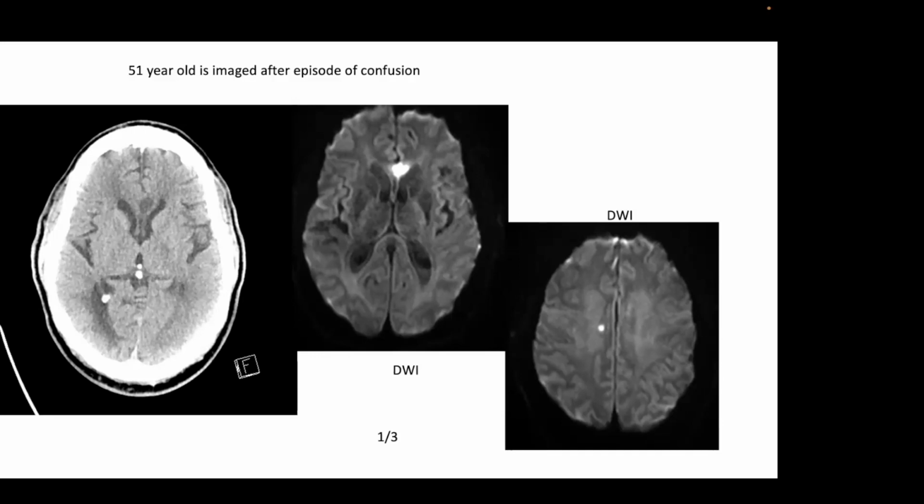So what should we be thinking about in this case? Post-traumatic cystic lesions, something like that. Exactly, right. Callosal lesions are common after trauma, but there's no history of trauma here. Stroke? Okay, that's a good thought. And we know strokes can have restricted diffusion.